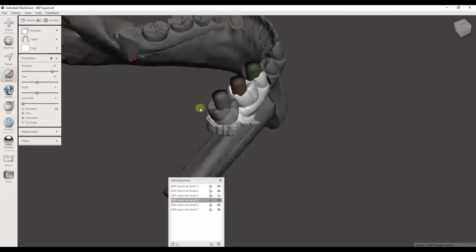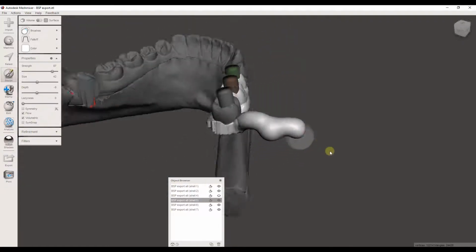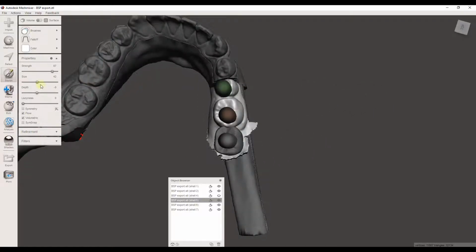And basically, just to show you an example, I'm going to do it here. And this is ridiculous, you know, it's always coming towards you. So I'm going to Control Z to undo that, but that's what this inflate tool does. You can kind of steer it a little bit, even though it's coming towards you. Control Z again to undo that.